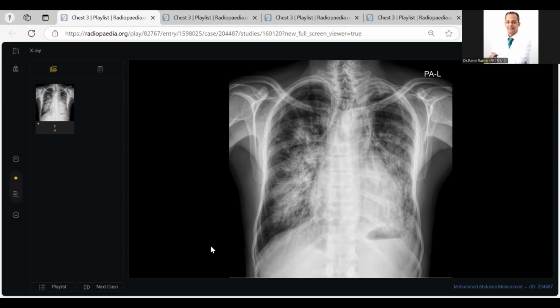There is no history of trauma, no intervention. We have just 1 minute, Zoom will shut down. 55 years old male patient of acute on top of chronic dyspnea. What is the name of this appearance of this chest X-ray?